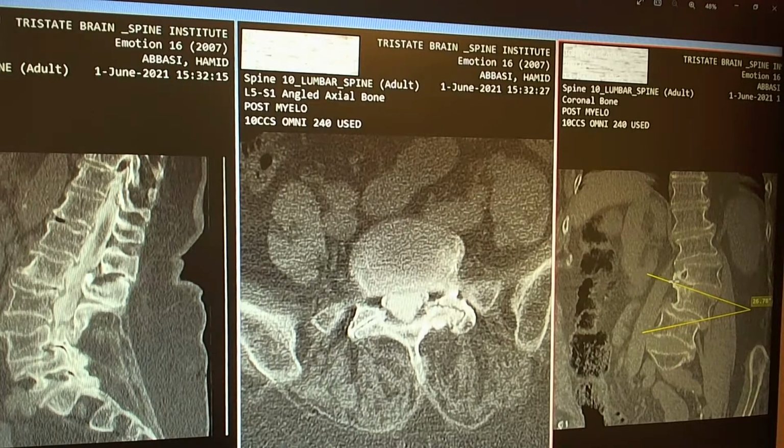Now, practically, let's look at that. This is colon, this is stool, and you see air inside of the stool from decomposition. There are two ways of decomposition. There is a bacterial decomposition, like what you see here, and if there is a decomposition not in our intestine, that would become an infection. That's very dangerous. You have to pay attention to that.